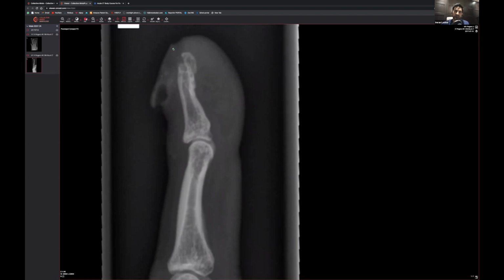Nail avulsion, yeah, you're right. Look, can you see that? It looks like the nail is there, and there's a little bit of air located in a few tiny locules over here. I mean, tiny little speckled calcifications along there.